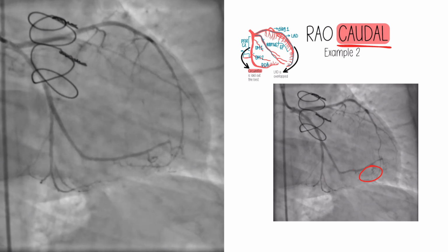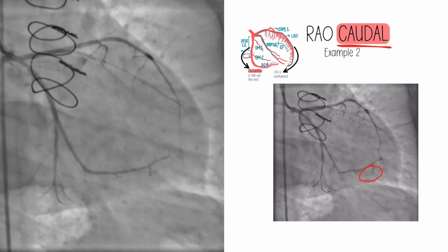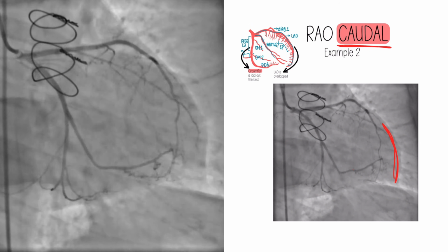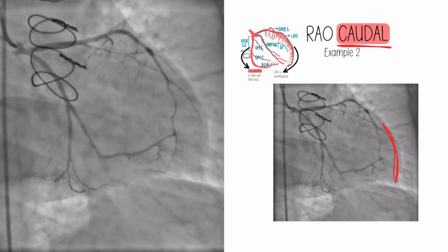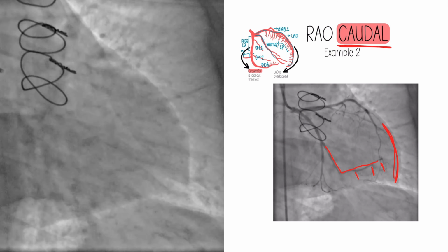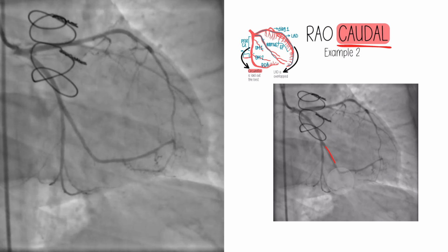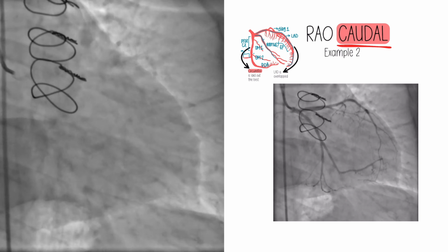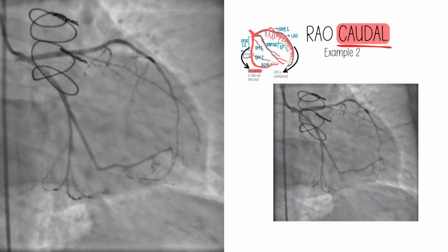And then you start looking for those connections in other views, and you start looking for those collaterals to see if they're filling in the gap of a space that you're missing. And then this could very well be an OM, and instead of septals, these are actually collaterals. So yes, the picture-perfect angiograms that you practice are important to have a super solid foundation.